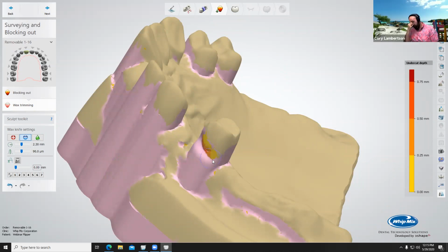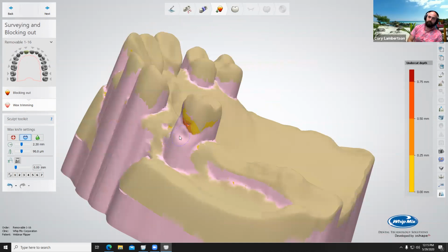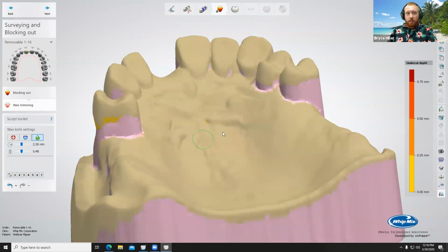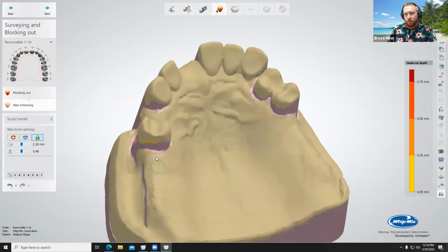Now for your flipper, are you actually going to place a clasp around that area? Not really. More than likely you're going to be using a wire clasp. I'm just kind of showing what. That's a really good point. What we're going to be designing today is the acrylic portion. Then after you print it, you could grind out a little channel in that base plate, bend your wire clasp, backfill it with resin and cure it. And then you've got your flipper.